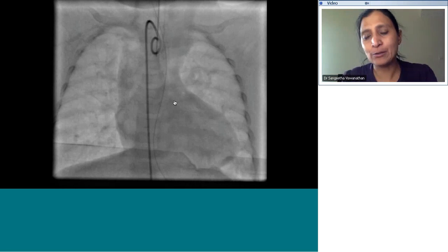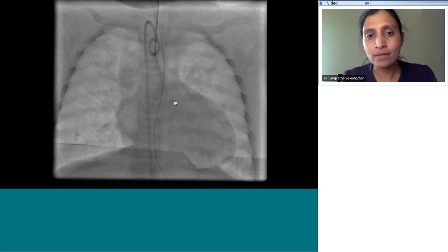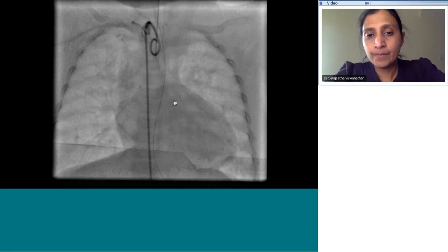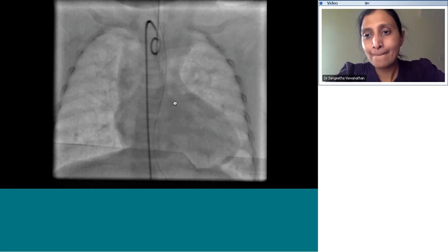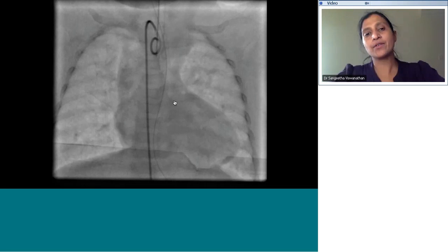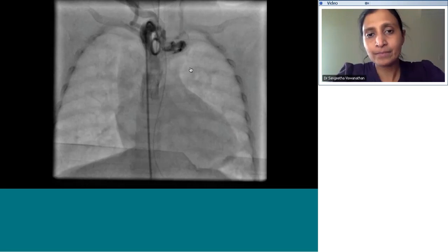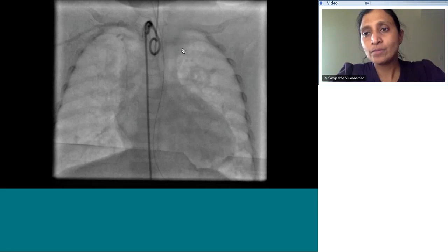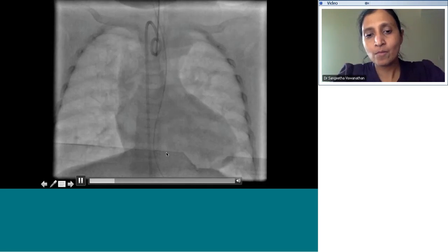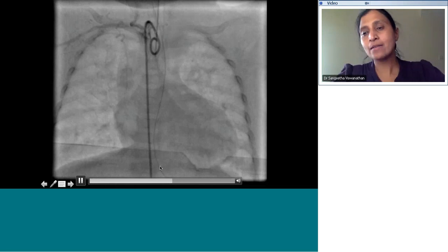The complete diagnosis. So where is this? Where is the angiogram being done? Come on, guys, wake up, wake up.